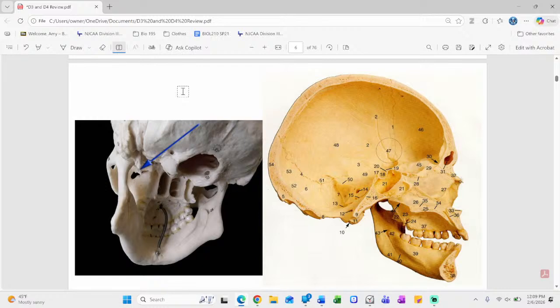So we've seen this. My D2s have seen all of this, and I am using this again. Knowing, and of course this is our area, right in here where it is the busiest. If you have any questions there, and of course looking from behind, we've looked at the inner surface of the mandible, even where the metal is here and the screw. Those are important things down here.